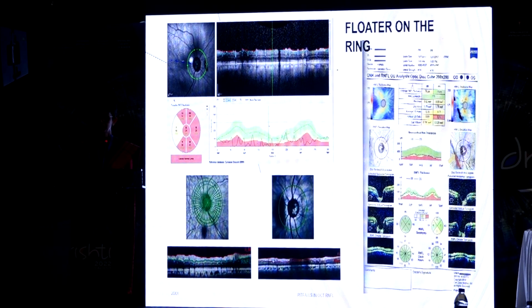After looking at the position, you also look at the area which is covered by the ray. So here you can see that there is a black area. It is a floater. Similar to a floater, you can have peripapillary atrophy, or you can have myelinated nerve fibers which can prevent acquisition of the OCT. And so you can see here, correspondingly to this nasal area in the B-scan, that there is no acquisition of scan and poor segmentation, which leads to this touching the x-axis.